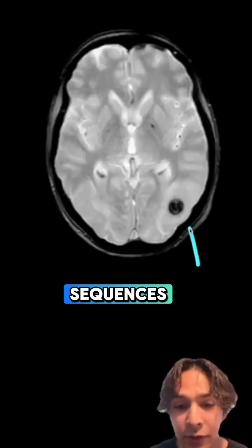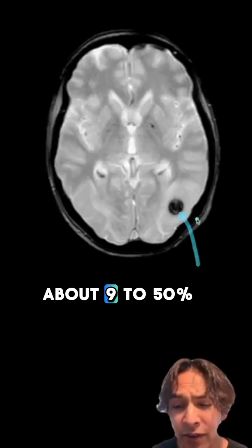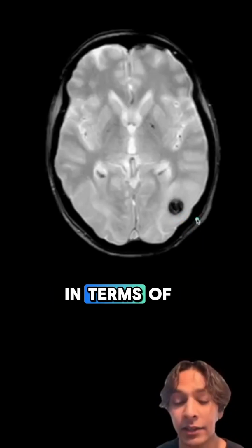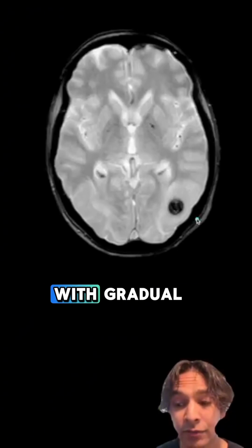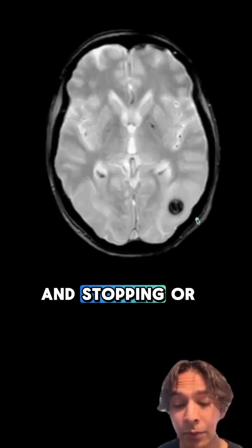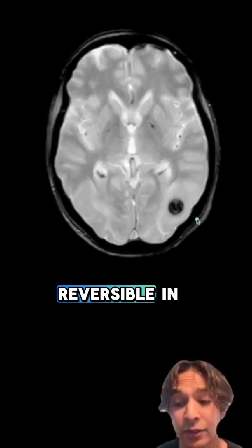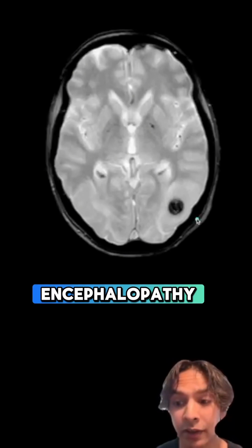On heme-sensitive sequences, you can see microhemorrhages in about 9 to 50% of cases, and that's thought to occur due to microvasculature friability. In terms of management, it's mainly supportive with gradual lowering of blood pressure and stopping or switching any offending drugs. Most patients normalize in days to weeks, hence the reversible in posterior reversible encephalopathy syndrome.